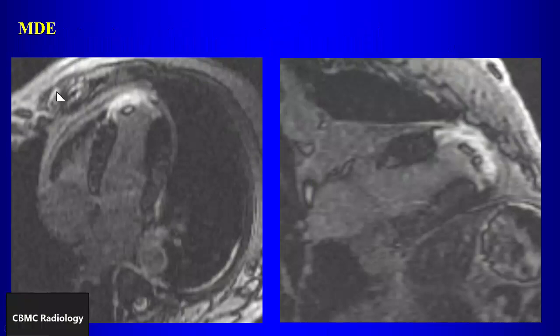Does that surprise you? No. So what is that from? Infarct. And what distribution? LAD. How do you know that's an infarct and not anything else? It's in that distribution and involves the endocardium. Yeah, so it involves the endocardium, it's in the distribution of the LAD. What about these filling defects? They don't enhance.